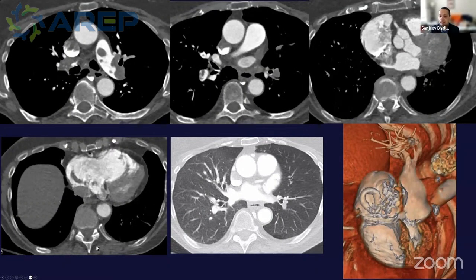Another example, this is a patient who had acute pulmonary emboli with right heart strain. You can see the right heart is big. In fact, in this patient, there was a deep venous thrombus which had migrated to the right atrium. And what's difficult to appreciate is this thrombus was starting to cross over a patent foramen ovale. That is sometimes known as thrombus in transit.